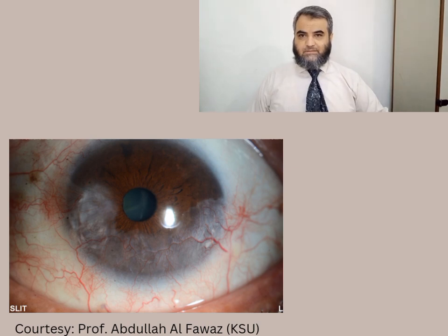This is a slide of the anterior segment photograph of the patient. Here you can see that the corneal vascularization is from almost 3 o'clock to 9 o'clock, and the superficial vessels are crossing the limbus, and there are fibrovascular changes, along with mild cataract changes.